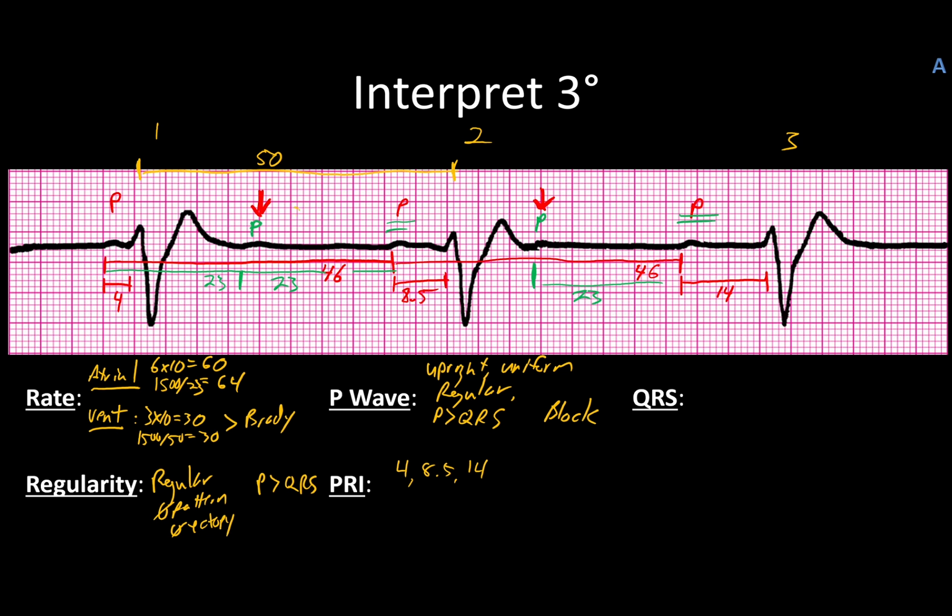I'll go ahead and draw our usual orange one to indicate where we're assuming there's some dropped beats at. And in fact, if you measure out the next 23, that we go maybe about, this is where our next P wave should be hiding, and it would be within this T wave, which would fit the pattern appropriately because I don't see anything in this zone out to the side.